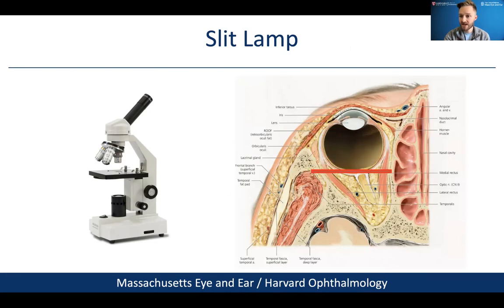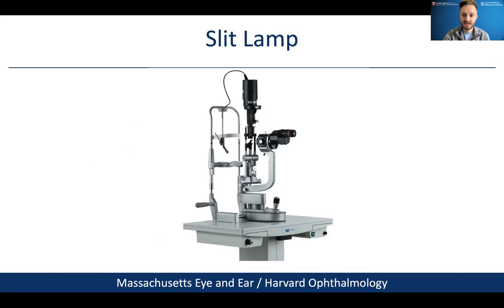Unfortunately, the slit lamp doesn't have a knob that focuses back and forth, so we'll need to manually control the slit lamp to make sure that we can evaluate things at all depths of focus, and we'll talk about that in a second. So let's imagine we're sitting now in front of the slit lamp, which we will be together soon. First, we need to know that the on-off switch is at the bottom hand corner of the slit lamp, usually a green knob. Sometimes there's a twisting knob. Some slit lamps differ a little bit, but first things first, make sure you turn on the slit lamp.